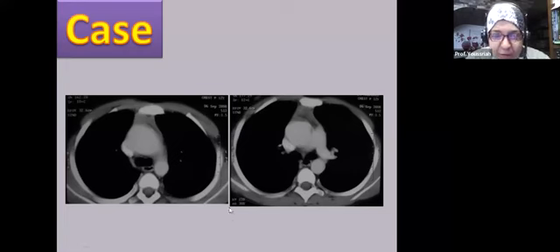So the etiology is most likely something else rather than atherosclerosis, of course. In this case, it was a case of Marfan syndrome. Mind you, here there is an artifact commonly seen with vascular structures that simulates dissection on the periphery of the aorta. But if you follow it, you will see that it's continuous outside the vascular structure. This is the clue to know that it is actually an artifact.